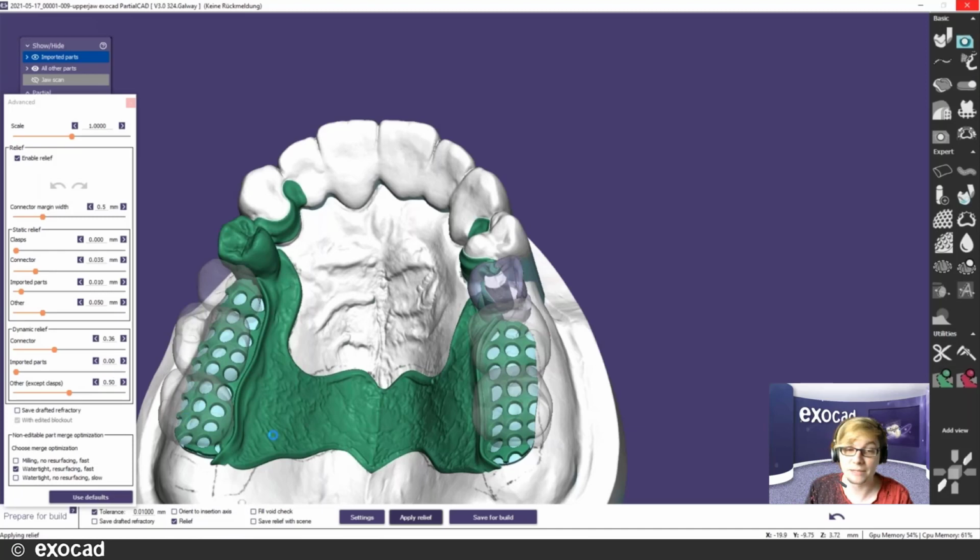Obviously, for a big plate like this, if you have hard edges on your plaster model, the software tries to create something like a relief that intuitively follows the shape of the plaster model. So if there are hard edges, it blocks them out more than on just a flat surface. So it's not just one value stuck on top of it, but more like, yeah, it's dynamic.